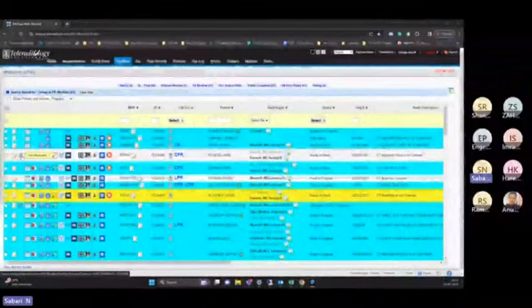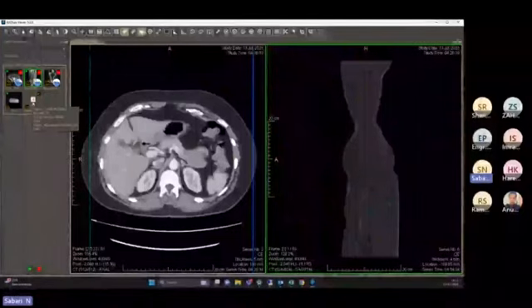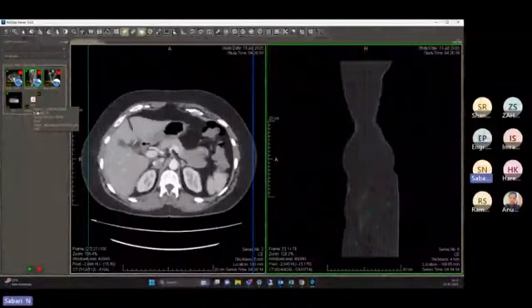When I open those images, the attachment will also come into the viewer itself. That is one of the very good features. If you ask me, I have never seen this feature in the AGFA viewer.